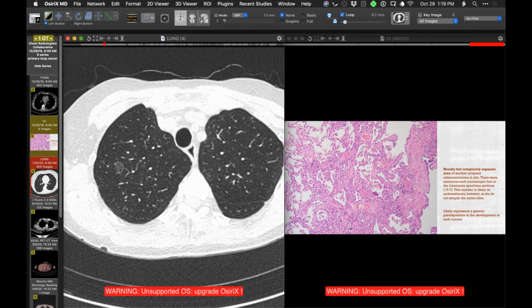It's interesting that when it was first observed, it was around 6 millimeters. If one followed the Fleischner criteria for GGO, no follow-up is suggested, at least for that number and smaller. And if they had not done a follow-up, they wouldn't have discovered this. The slight growth over time. All right, those are my cases.